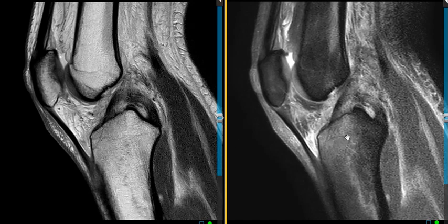On this view, it's more sensitive because marrow is fat suppressed and it should be dark like this, but there's a big area of brightness in the tibia. So a really prominent impaction injury here, bone injury of the anterior tibia. Also, we note on this view the brightness here. This is fluid in Hoffa's fat pad.